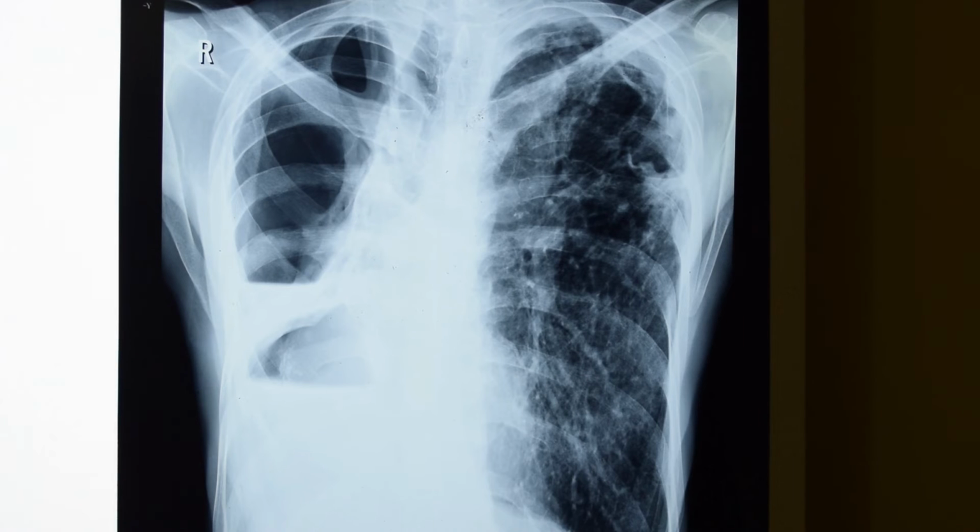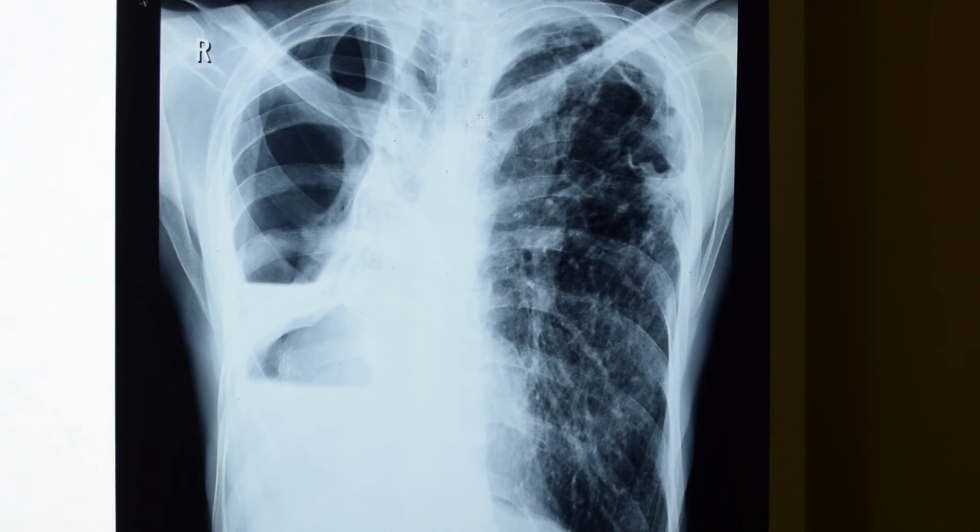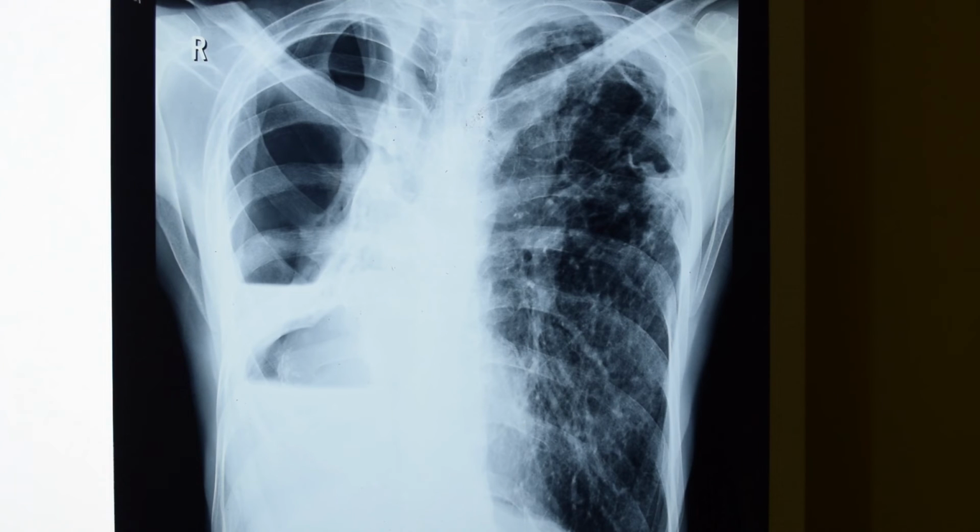This is another chest X-ray, this is the left side, this is the right side, and as I have told in the same video, if there is an element of fibrosis, the trachea will be pulled towards the side of fibrosis. Here you can see the trachea is on the right side, and there is hyperinflation on the left side. There are small, very shiny spots. These are known as post-TB calcifications, and there are small cystic shadows which show cystic bronchiectasis.